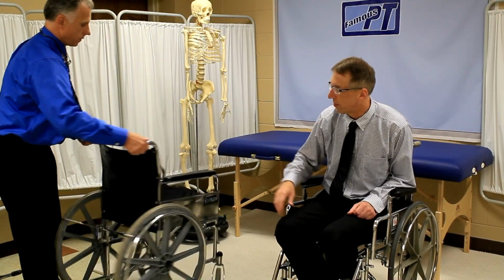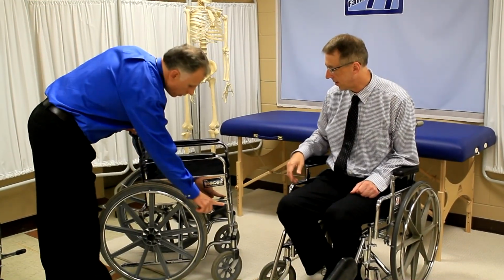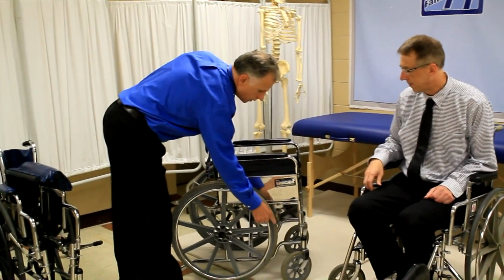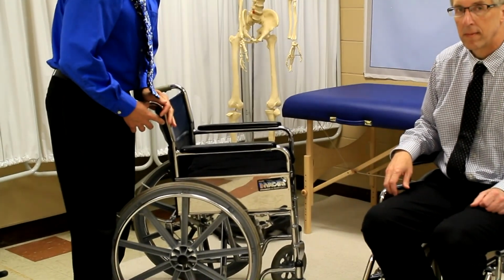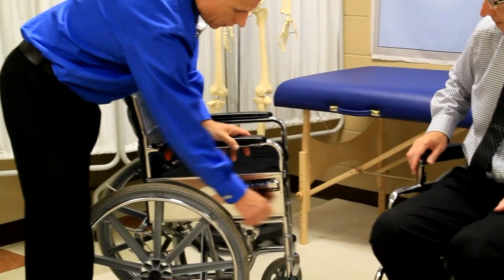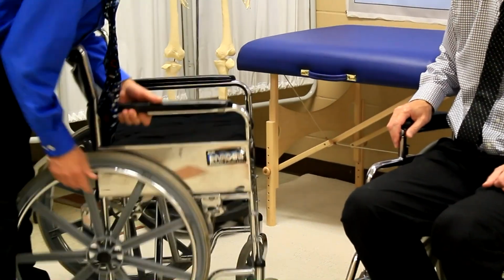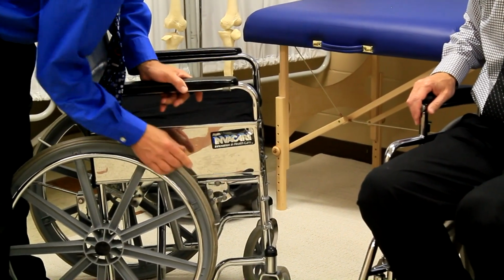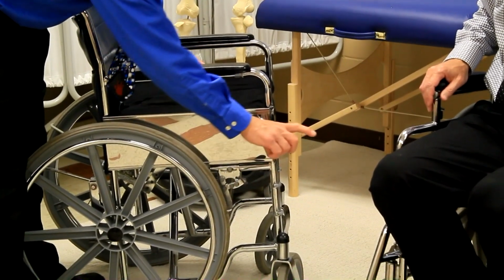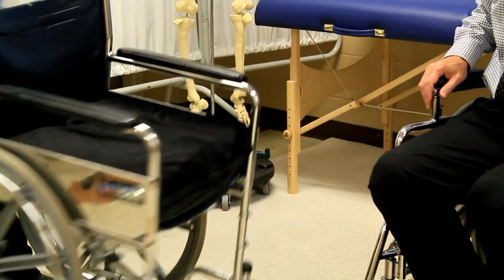I want to show the brakes real quick here. Let's talk about the brake extensions. We'll look at the standard one first. Can you see this, Lonnie? This one right here. So here, the wheel's spinning and you lock it, and this is a typical brake on a standard chair. Now, the really nice thing to get is an extension, particularly for people who don't have a lot of arm strength or finger dexterity.